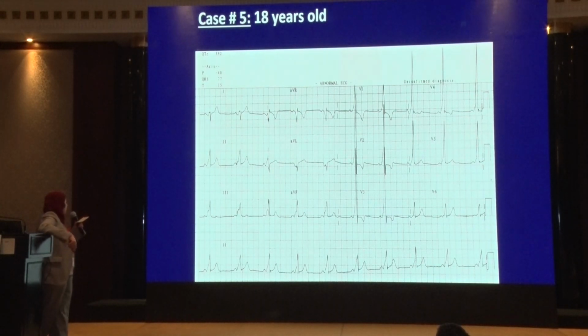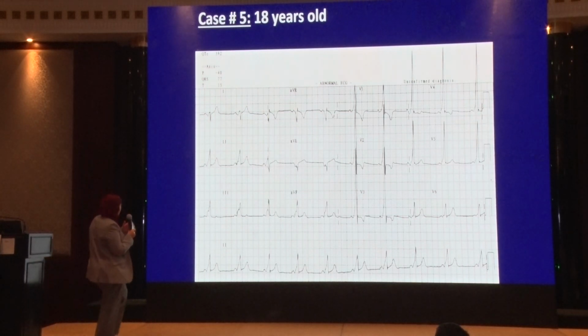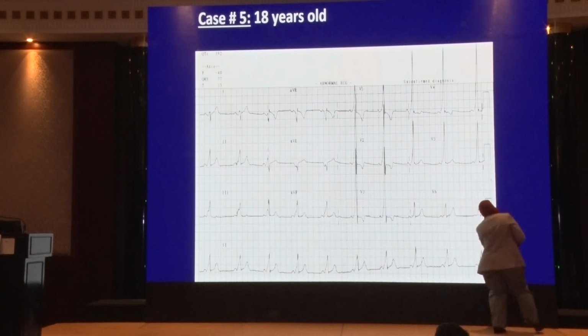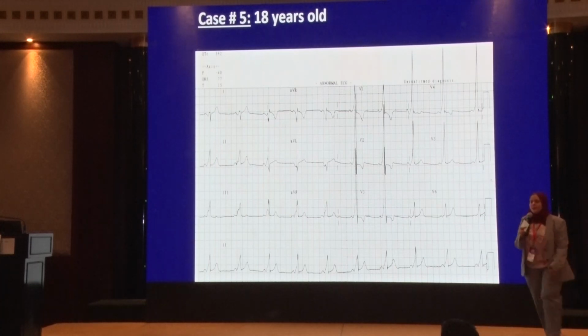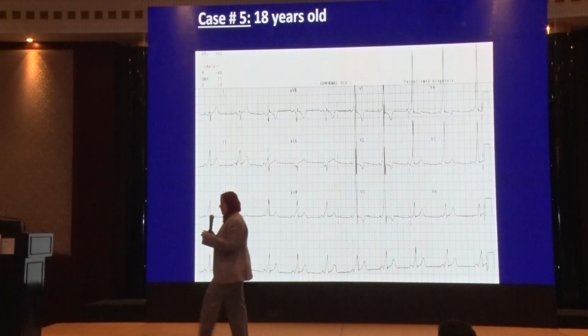He is 18 years old. What do we have? We have the calibration here. It's 2 squares, so it's fine. Calibration is not a problem. What do we have? What is the rate? Who will start to calculate the rate?